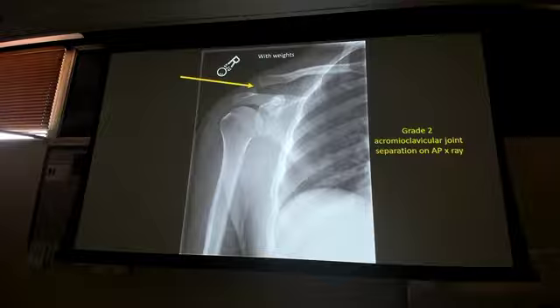I need you to recognize the AC joint. And you don't need it because, remember, this should be down here. This should be a fairly continuous line to the top of that clavicle. I have that step off or that step up, however you want to look at it. So I would like to have the other AC joint to compare, but I don't need it when it's this abnormal. Remember, that should connect together quite nicely. If it was a normal AC joint, we wouldn't have that separation. I've got a step up, or step down.